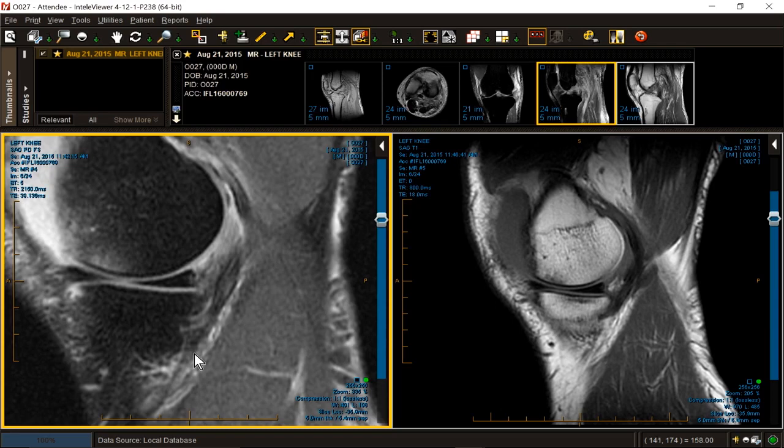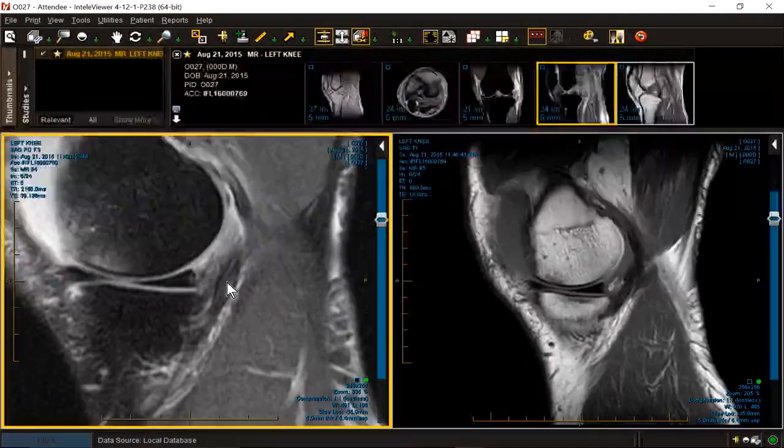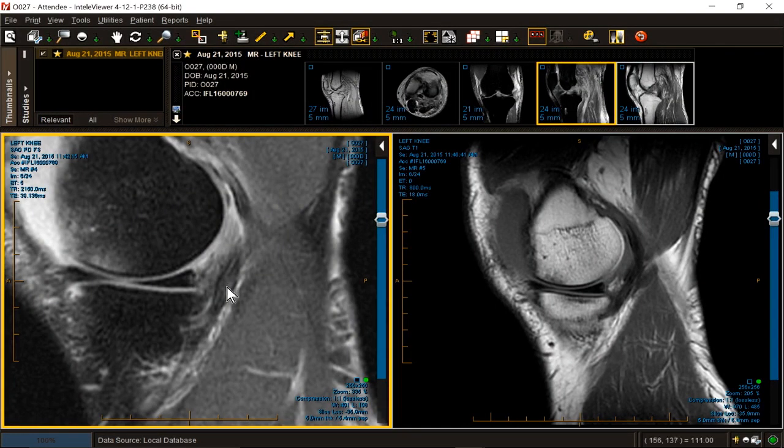There are 5 major components of the posteromedial corner, and there are also 4 or 5 subsegment slips or attachments of the semimembranosus, and we will cover those. But this is just a quick look at it. For those of you that are at the more novice stage or intermediate stage, the most important thing is for you to recognize that the semimembranosus itself is not detached, but the posteromedial meniscocapsular reflection is injured.